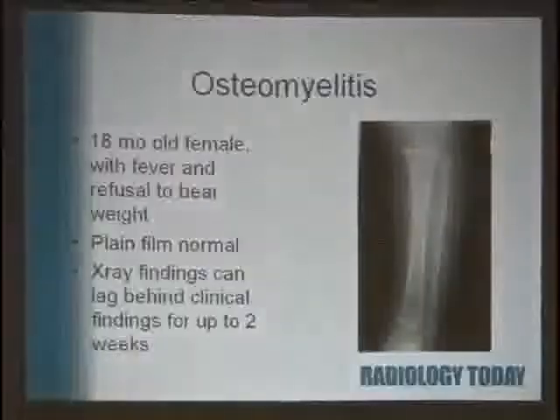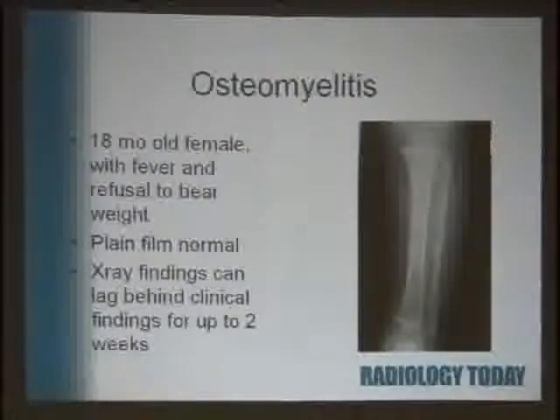This is another little girl, 18 months old, and how many times do we hear this? Refuses to bear weight, won't put her foot down. Well, who knows? That could be everything from, I don't want to get my Barbie sandal dirty, to, I've broken my leg. Her plain films were normal.